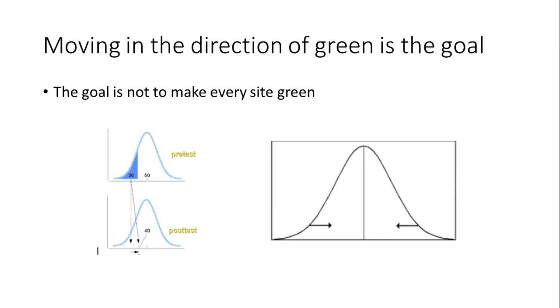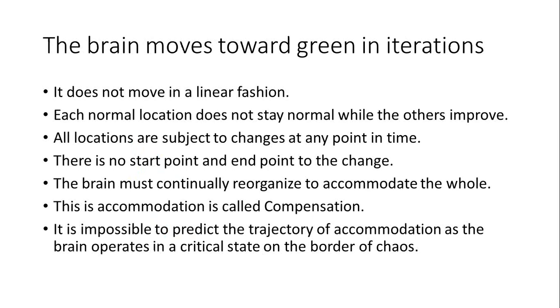But it might not show up in the colors on the head map because, as you can see, they're almost ordinal measures. They're categories of 1, categories of 2. And you're moving within that category. That's important to keep in mind. That significant movement, clinically, not statistically, clinically, can occur within that 2 to 1 standard deviation region.